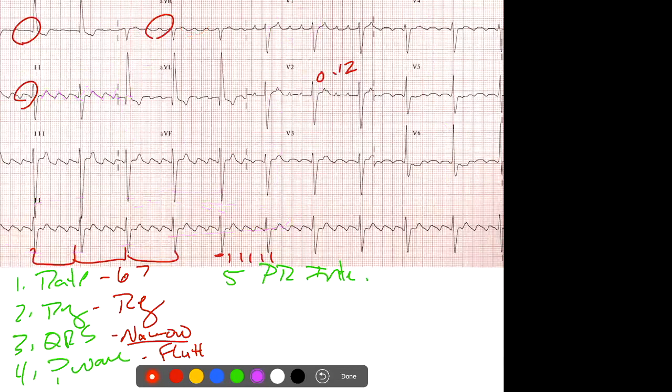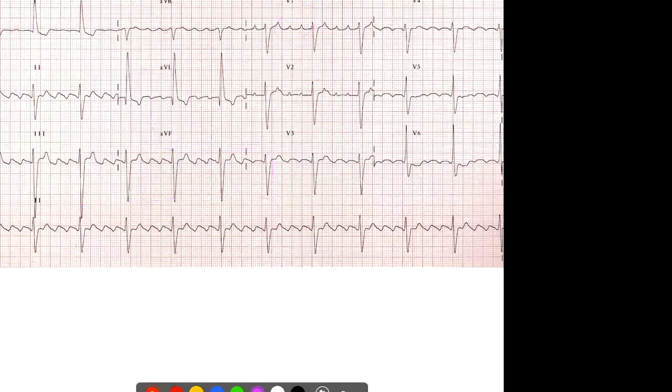And right here, and your P waves looking up here. Okay, good job. That's all the ones I had to go through. Questions about any of this stuff we haven't covered?